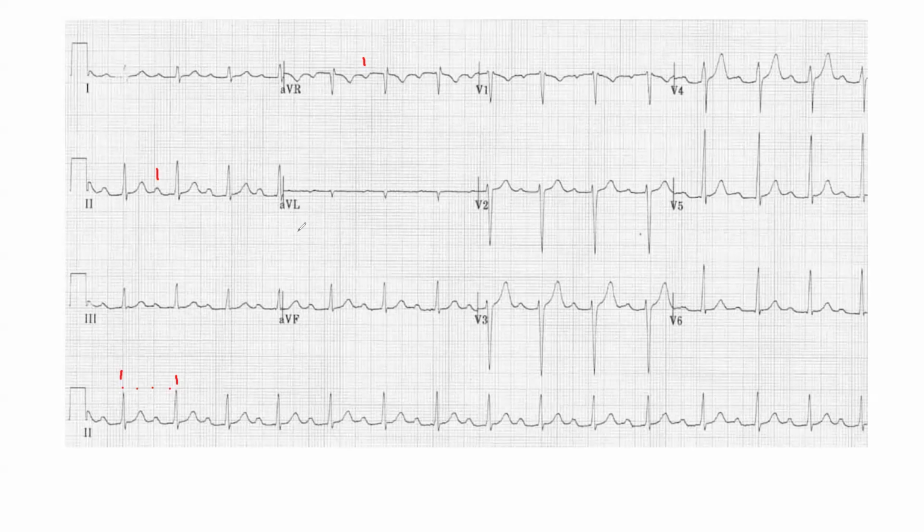Lead 1 positive, AVF positive, and lead number 2 is the biggest one after 3 and 1. It's the normal one, between 0 and 90.